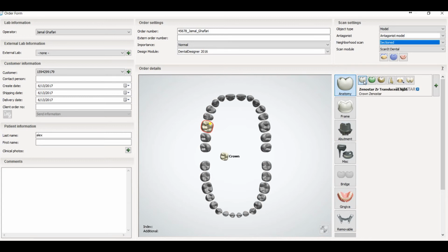You have the options here. First option is crown, then there is crown pontic, and onlay, inlay, then you have veneers, and then you have temporary crown, temporary pontic, temporary and prepared model, and double tops. And then there is an option related to the artificial tooth or the denture tooth. So what you are going to select, you have to check here. Then after selecting that, if you want to cancel, just press this one and press this option, and it will be deselected.